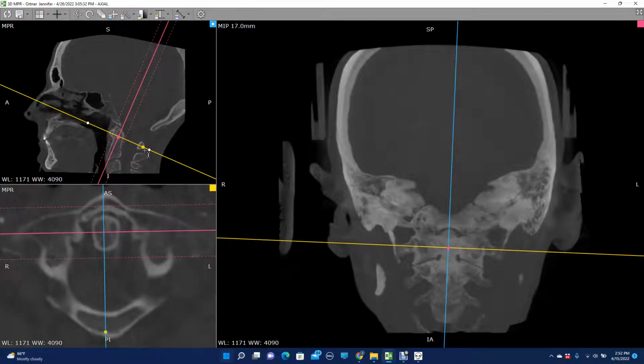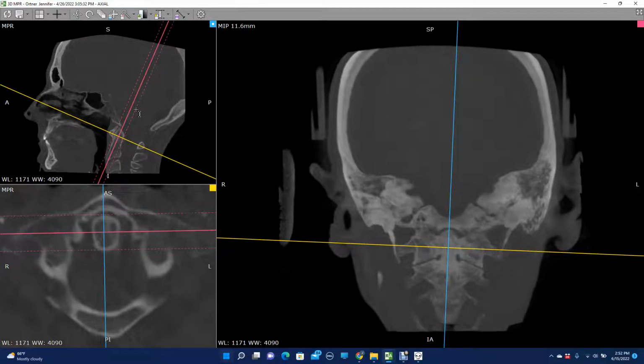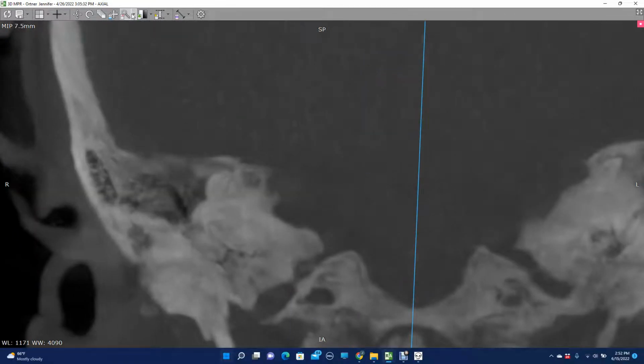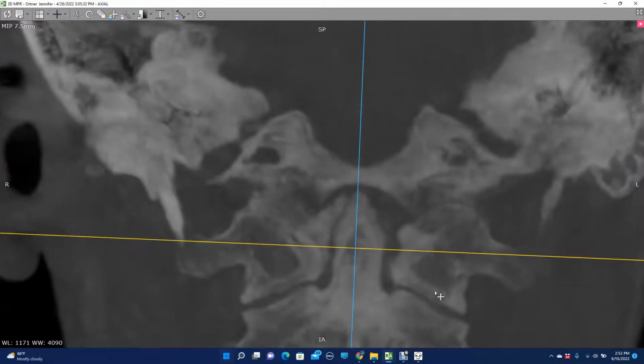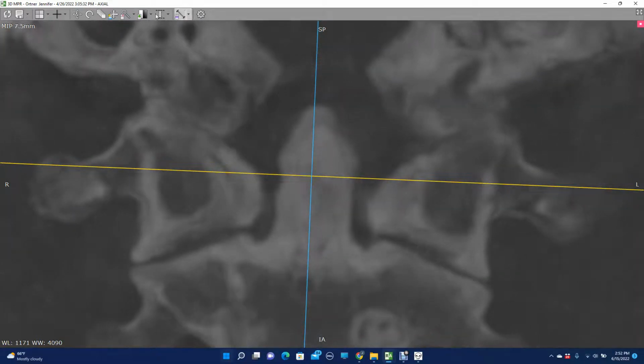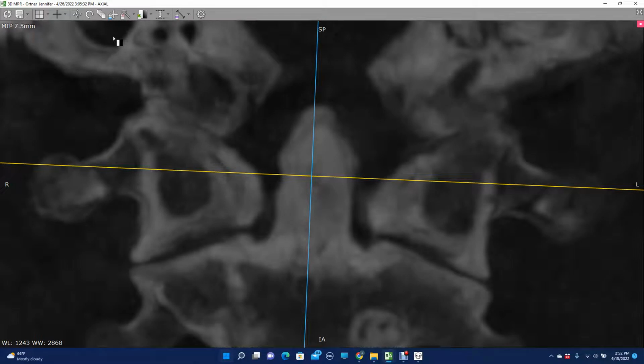So, we have our image prepared. It's on the plane line. It's aligned to the rotation of the atlas. We see it there. We add just a little bit of thickness to it. We can zoom in on here before we measure our plane line. And just really finish preparing this image for measurement. And I think that's where I want to measure it.